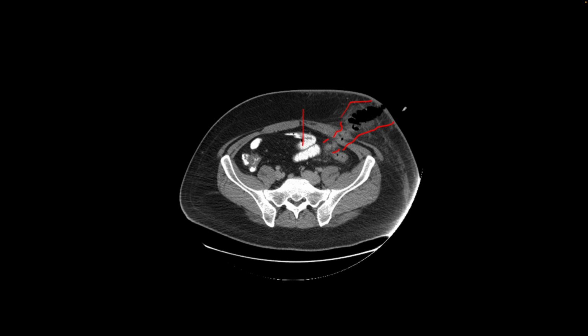That is a common complication when a catheter is placed, so it's very important to look back on the prior studies to figure out what was done in this region and what could have developed into something like this. The importance of oral contrast is that when there is an enterocutaneous fistula, you're looking for any contrast extravasation into the intraperitoneal compartment, and if there is any, then this patient definitely needs surgery.